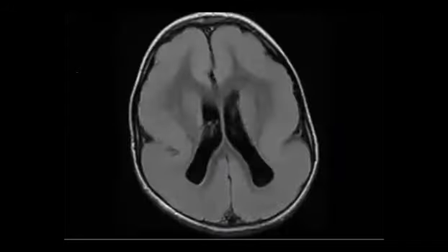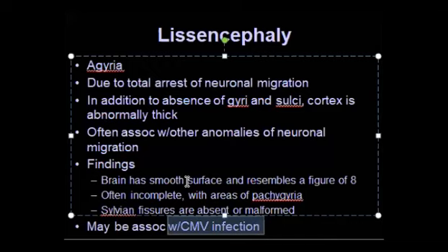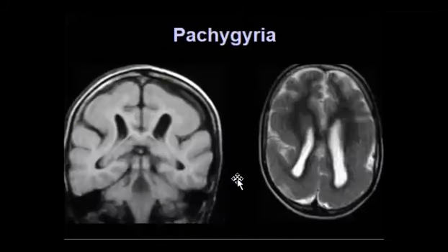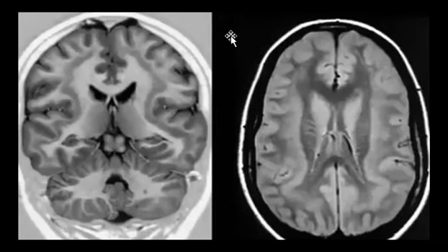This one in the neuro is an easy one. Lissencephaly type 1, which is a type, again, of migration disorder. And it can be associated with cytomegalovirus infection. It's smooth with areas of pachygyria, a smooth surface of the brain. So this one is pachygyria. And this one, again, is a migrational disorder: band heterotopia. Yes, band heterotopia.